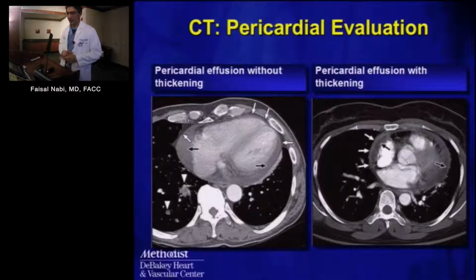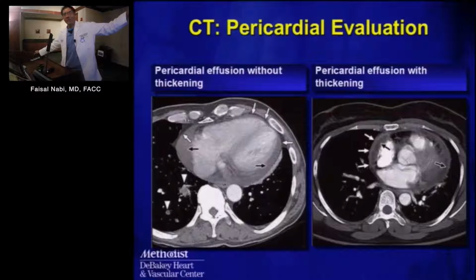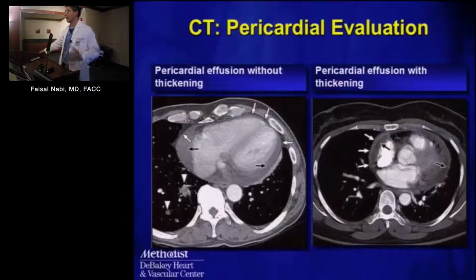transudates or exudative processes. And on the right-hand side is an image where you can actually compare a much thicker pericardium to that normal thin curvilinear image I showed you on the screen before, showing you what a thickened pericardium would look like. If you look really closely and if it projects well, although this is the strength of CMR, you may agree with me that you may see some contrast uptake in the pericardium on these images. And that would be, again, our surrogate that there's probably some inflammatory process ongoing here.